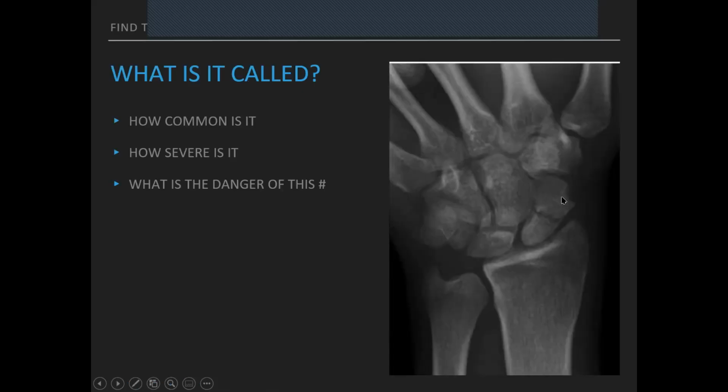Now we're going to look specifically at the carpal bones. Remember, we have scaphoid, lunate, triquetral. The first thing you'll notice if you look at the arch is that it's displaced. It doesn't look like a normal arch. That can also be because of hand position, but even if you don't consider hand position, you can still see that it doesn't look 100% like what it should. We can notice an easy fracture over here, and we can also notice displacement of the bones. The distance between the carpal bones is increased. But if you really had to look at it, this is a scaphoid waist fracture.